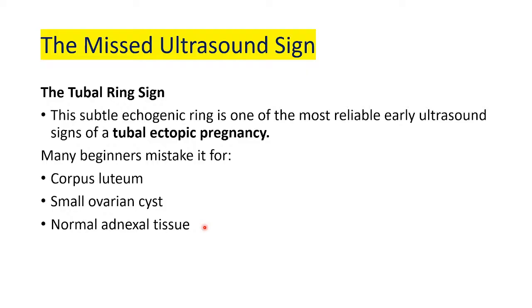You should have the eyes of an eagle to be able to pick these silent or subtle pathologies, especially in early stages. And these are included here. Why? Because a first trimester obstetric scan overlaps with a gynecological ultrasound, because most patients come to the department unsuspecting that they are pregnant. So these are the incidental findings that every sonographer should have at their fingertips.